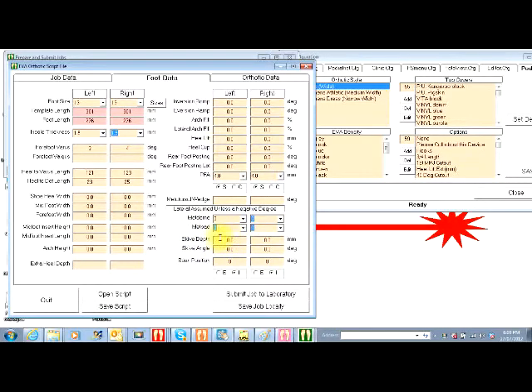We can also handle skive. Generally, if the podiatrist likes to use the skive, they can add it there so that we can set it up later on. And the scan position is normally, say they want a higher arch and they've determined, I've got some podiatrists that like to, if you've got a tibial varum of 15 degrees, they'll get me to scan the foot in at 15 degrees. And then I've got to tilt the whole foot over, whether it's inverted or everted.